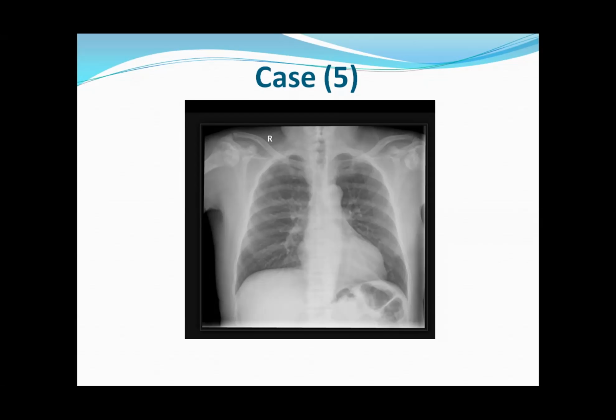In my usual practice, I would window the case and look at the skeletal system. Any abnormality in the skeletal system?